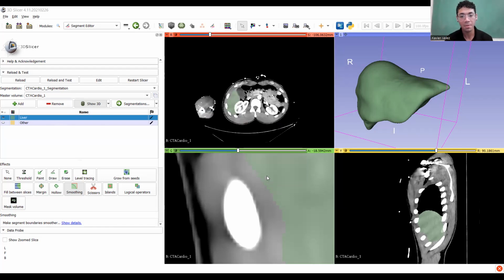So okay, I'm going to export that, and you can see that I did this earlier at 3:46 p.m. Now I'm going to open this with Microsoft 3D Viewer. And we can see, wow, that's our liver that we just segmented. That's crazy. Good job, guys. We did it. That's super exciting. We are awesome.